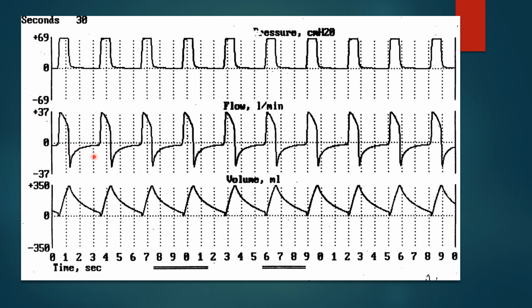And so can you tell what this patient's expiratory time is and inspiratory time and IE ratio? Well, let's look here. These dotted lines coming down like this are 1 second apart. So if we take a breath that looks like right here, starting at about the 1 second line, this respiratory pattern we're seeing here is short inspirations and normal exhalation. In other words, our IE ratio looks to be about normal.